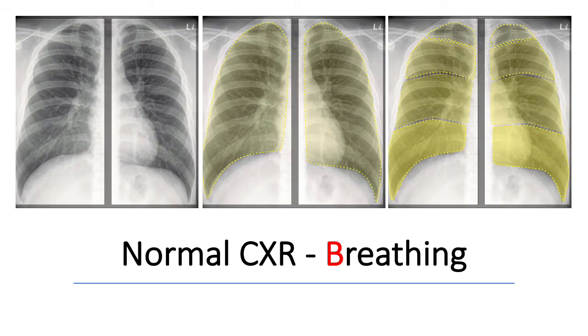Next is B for breathing. Here we're looking for lung and pleural pathology. Both lungs should be well expanded and similar in volume. Can you count 10 posterior ribs bilaterally? Is one lung larger than the other? Next, you'll compare the apical, upper, middle, and lower zones in turn. Are they symmetric? Are there any areas of increased density?